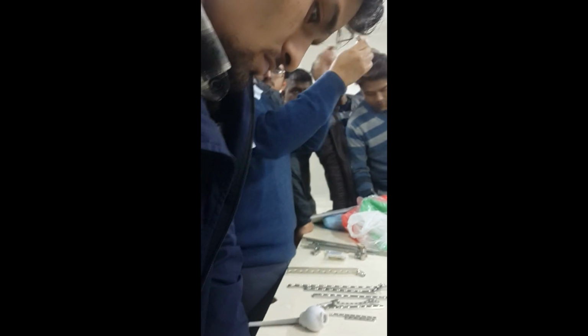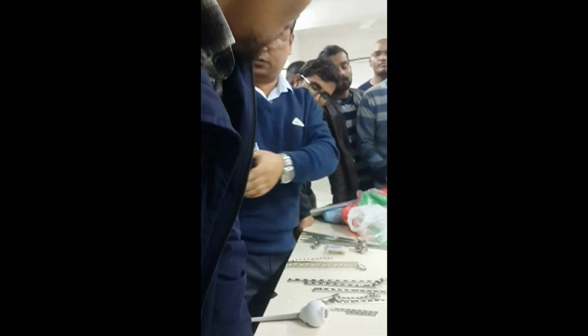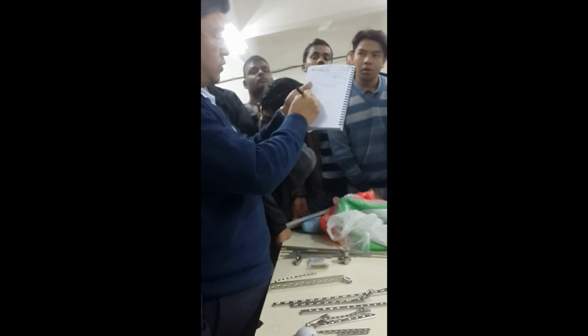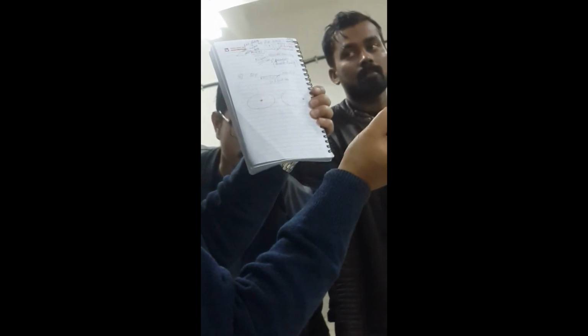So how you do it is, since it is an oval hole, you have a choice where to place the screw in the hole.